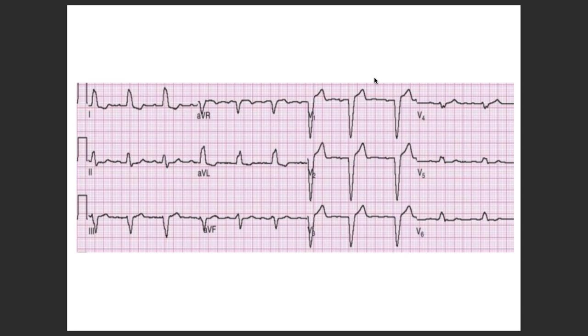I don't want to divert you again to those things. On a simple basis, there are different rules, and there are simple rules as well. So it is more than 4 boxes, isn't it? Is it going to be less than 75 beats per minute, or more than 75 beats per minute? Approximately, if we try to be precise, 1, 2, 3, 4, nearly almost 5 boxes. I would say 1 box short of that. Yes, exactly, so she's almost there, in fact.